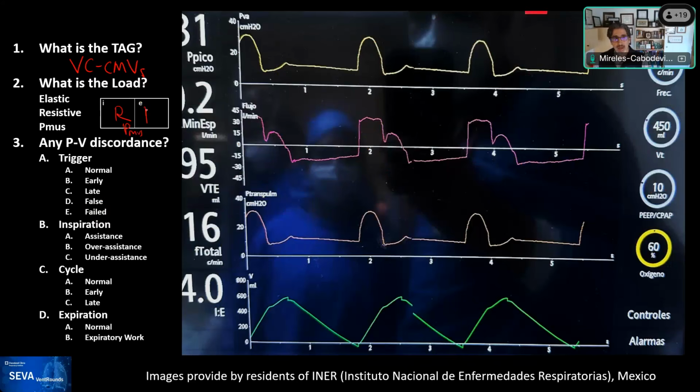So whenever we see this, the active thing is either activation of the expiratory muscles or there is increased resistance in this patient. Rob? Almost looks like flow limitation, doesn't it? Yes, it does. It looks like what you would expect on an expiratory limb of a patient with a tracheostomy, right? No peak flow and a constant flow consistently because of severe flow limitation.